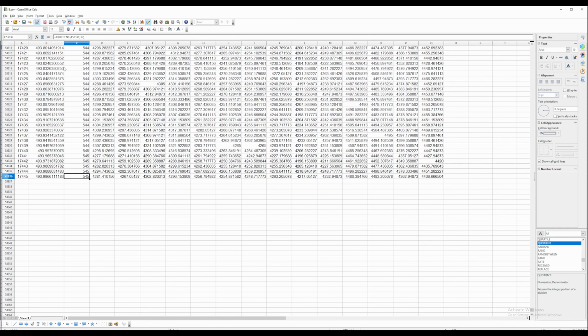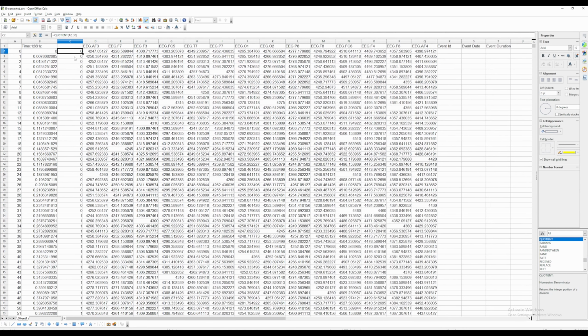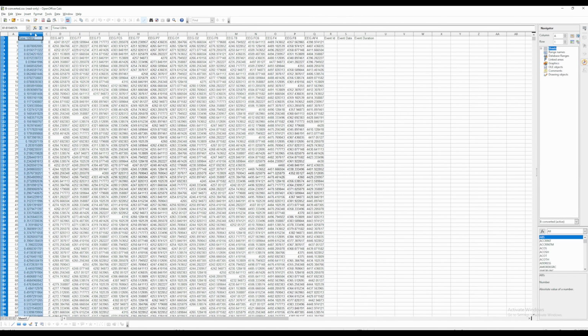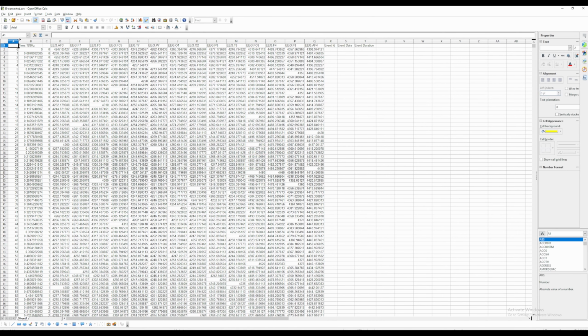Now we just have to save this, to sort of solidify this and get rid of the formula. But another way is to just click this button. This takes it out of edit mode. There we go. And if we go back to edit mode, now it's editable again, so now we can get rid of this column, but these are now numbers and they're not related to this column anymore.